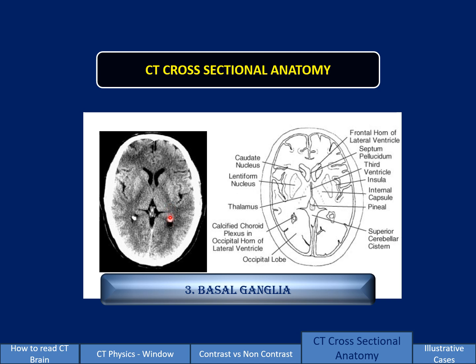This is a choroid plexus, which is seen within the ventricle. This is again the ventricle. This is part of the parietal lobe, occipital lobe, and this is the frontal lobe. More important structures are concentrated at the basal ganglia, which need to be evaluated in cases of stroke.